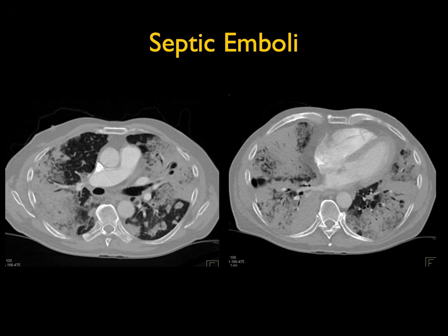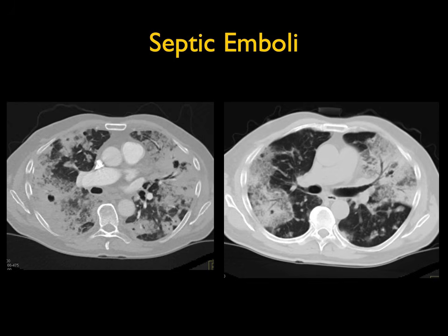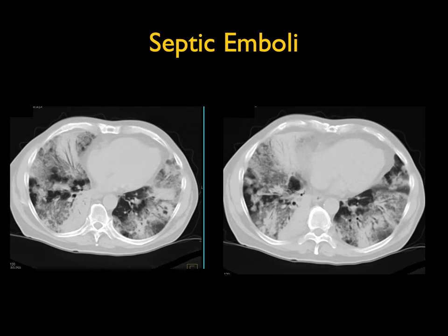And this is a really nice example of septic emboli, as well as patchy infiltrates. Again, usually you can make the diagnosis, though sometimes it is relatively challenging.